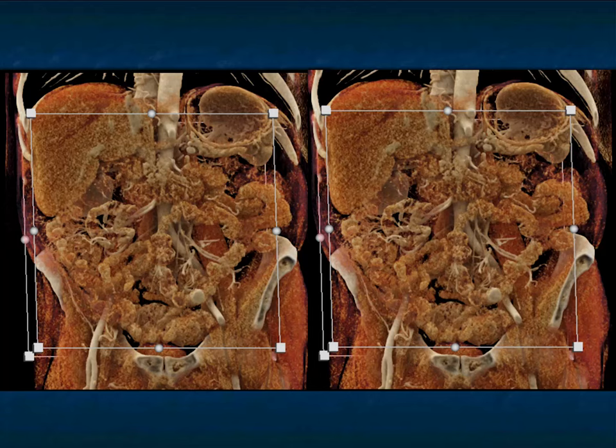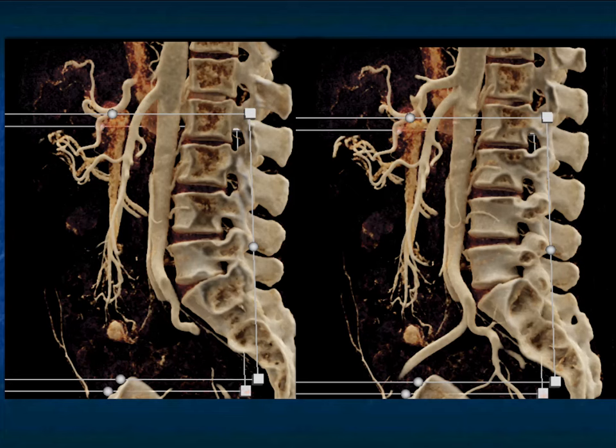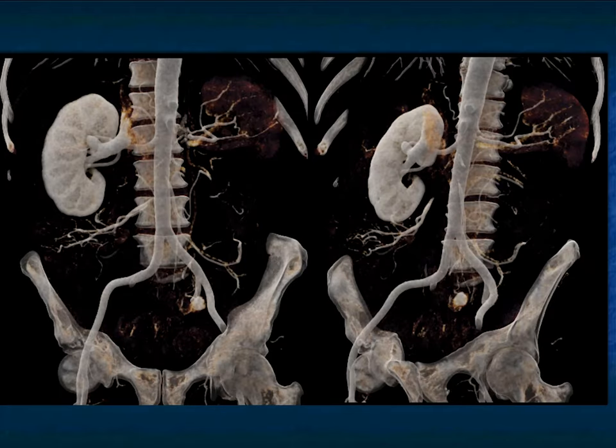What you also will see in this patient, and I'll show you a few others, after you get looking at the pancreas, again, the satisfaction of search, there's an enhancing lesion in the left lower quadrant. That's going to end up being in small bowel. You can see it very nicely here as well. You see the SMA, there's the branches of the SMA. That's the metastasis. So again, look very carefully. You see one set of lesions, you should be even more suspicious for additional lesions.